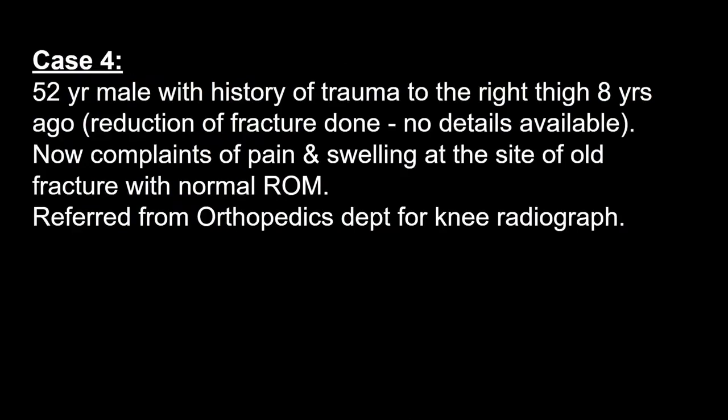Coming to case 4, a 52-year-old male with history of trauma to the right thigh 8 years ago. Reduction of fracture was done, no details were available. Now complaints of pain and swelling at the site of old fracture with normal range of movements. Referred from the orthopedic department for knee radiograph.